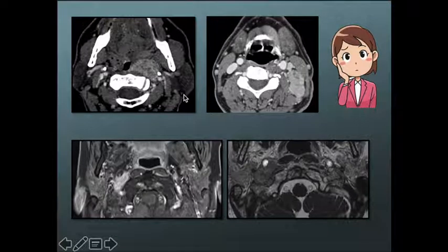This was also a somewhat difficult case of a lesion in the distal carotid space, very homogeneous, avidly enhancing and displacing the ICA anteriorly. Is that a vagal schwannoma? This patient had a history of prior treatment for lymphoma, and although she was in remission, she was presenting with new symptoms. She also had a PET CT demonstrating very avid SUV uptake in this location, and this was further on proven to be lymphoma.